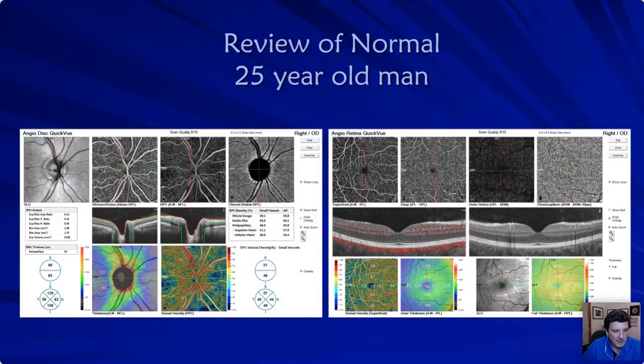And we get a nerve fiber layer scan here, a nerve fiber layer scan here, and an inferior here. And this is just beautiful, healthy, robust. Whoever would have thought that you could use angiography in glaucoma? Where I find angiography very useful is in patients with diabetes, patients with macular degeneration, and now glaucoma. It's another structural test that we can do.